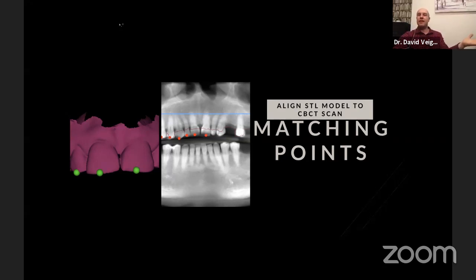That then allows me to overlap the prosthetic envelope that I'm planning for the patient, which has been approved by the patient, to where the bone volume is. And at that point in time, I now have all the data that I need. I have the future tooth position, I have the bone volume. Now, if it so happened that the patient's bone is so terrible that I can't do the case, well, we've already gotten up to that stage. We then just continue down the removable prosthodontic stage.